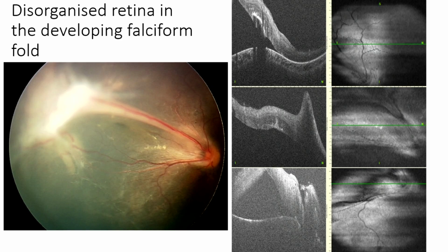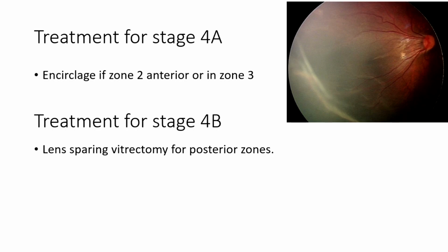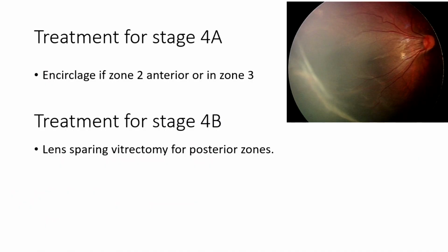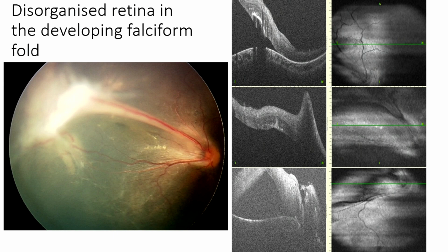Back, further back. You've gone too far ahead. So when you do an OCT, you see there's this tractional tissue over the retinal surface, and then you have tractional schisis and RD. The shallow RD is there behind this whole thing. So this is where we did a buckle, if it is zone 2 and anterior, or you do vitrectomy to release that traction. Okay. You're jumping slides.